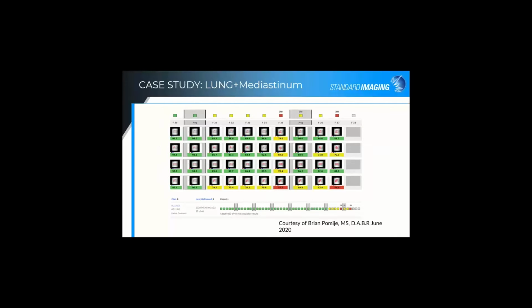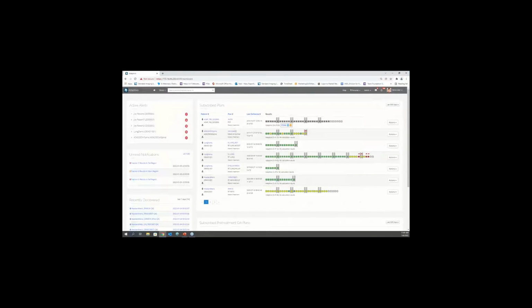And so now I'd like to go ahead and bring up the software, and I have this particular sample plan in Adaptivo. I'd like to take a few minutes before I go into this plan to get you oriented.